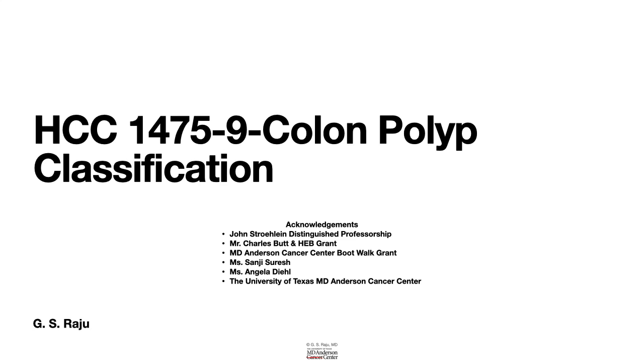Greetings. Let us learn about the classification of colon polyps. What we will do is learn about the classification and then look at the various endoscopic pictures to assign that particular classification.